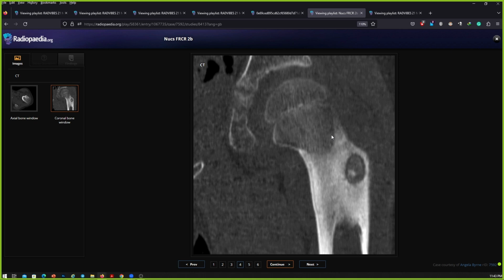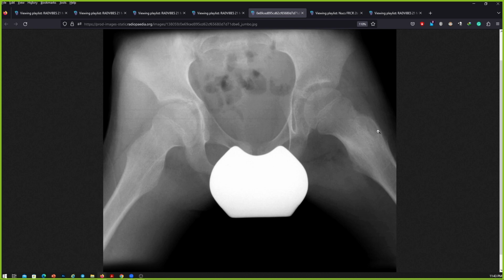Okay, so that would be all for candidate 1, and I think you did well, candidate 1. You tackled all the cases with confidence, you were clear and you were calm about it. So this is a case of osteoid osteoma. I had to point it out, but I agree that there is some difference in the lucency, and it sometimes will confuse you, but look at the entire picture, and it's always better to compare the two sides, which you did.